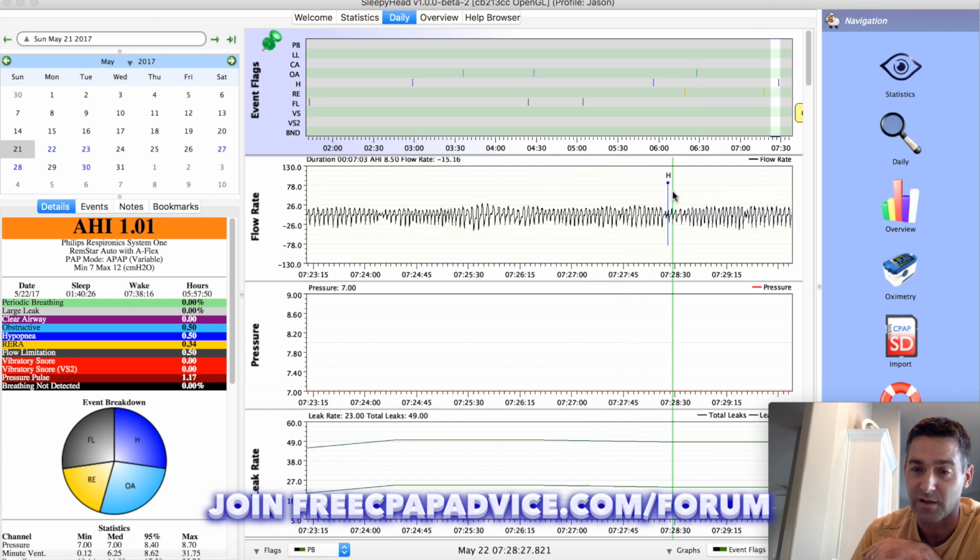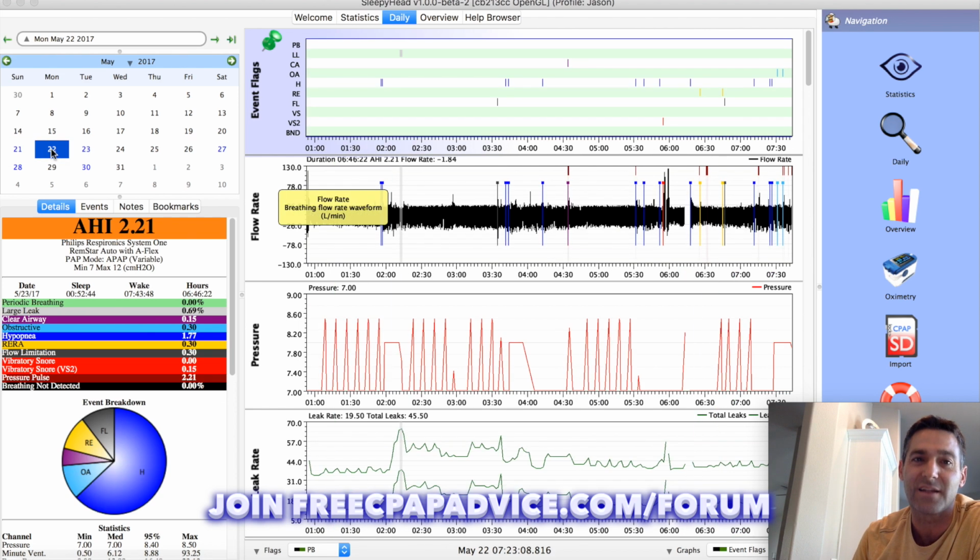Most likely. You can see that oftentimes the machine will tag stuff where there's really nothing even there. So why it tagged anything, I don't know. Just know to look for this kind of stuff. I'm saying dig a little deeper. I want to try to find some of the real common ones.